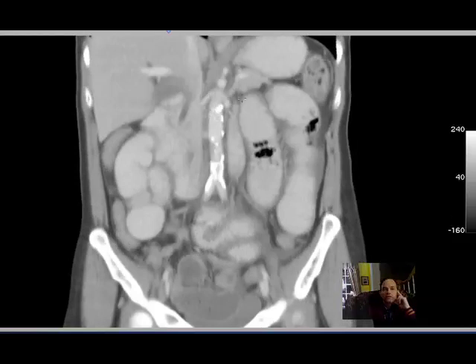And then what are these two? Well, what two arteries would come off the aorta up at this level? The renal arteries. So here again, you don't look at it and say, what does that look like? Does that look like a renal artery? Gee, what is it? I'm not sure. It all is about anatomic relationships. If it's coming off distal to these two arteries, there's a good chance it's going to be the renal arteries. And there are two of them. They come off at about the same level. Sometimes there's more than one on one or both sides, but the standard, most common arrangement is to have one renal artery on each side.